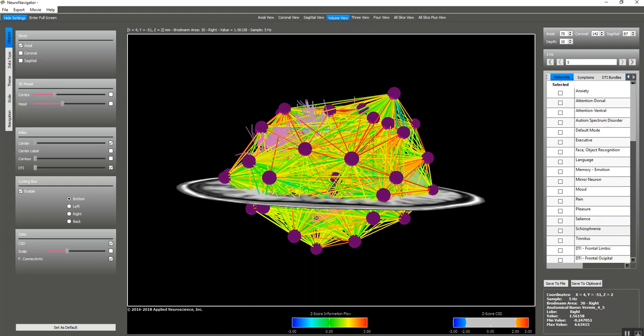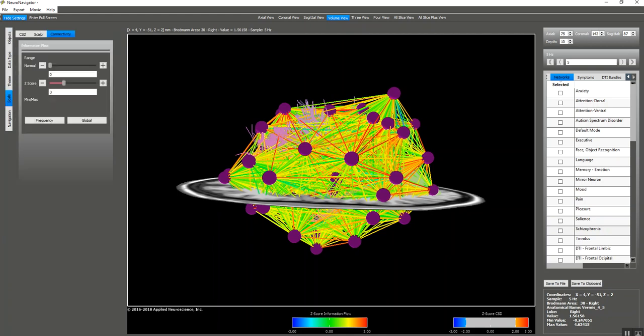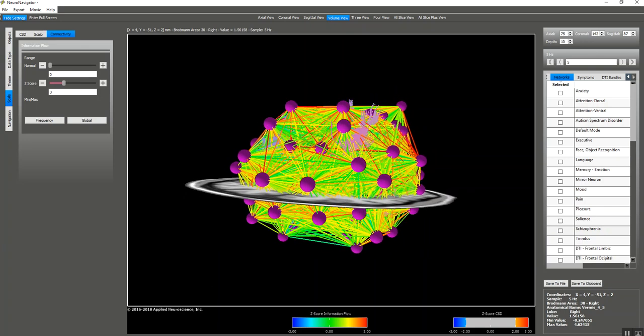The scaling for the hubs and for everything is here. To click scale, you can scale the current source density. It's between 2 and 3 standard deviations. That default setting you can change. When you launch the Navigator, it will retain your previous settings, but you can have your own default settings. Here are the settings for the Scout. It's 2 to 3 standard deviations. Connectivity, I've set all the way to 0 to 3 standard deviations so you can see all of them.